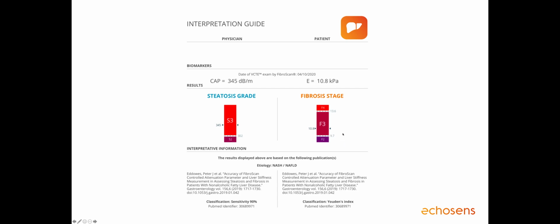And notice below those fields, there's an indication on this report, which is a PDF, that states what threshold value you used to make these determinations, because all the application is doing is comparing the thresholds in that publication to your patient's test values and displaying them graphically.